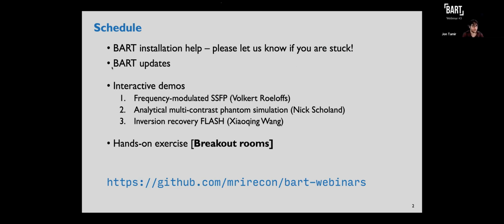I'll give a quick update on some BART related matters, and then we'll go into the interactive demos. Volkert's going to start us off with frequency modulated SSFP subspace reconstruction. Nick will talk about the analytical phantom tool we have and how we can use it to simulate subspace recons. And then finally, Xiaoqing will go over inversion recovery FLASH. At the end, we're going to use breakout rooms again to do an interactive exercise based on the inversion recovery FLASH on in vivo data. And all of the material is available on the BART webinars GitHub.